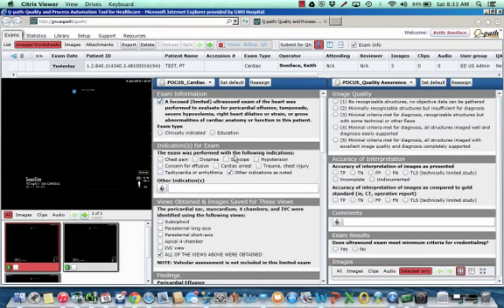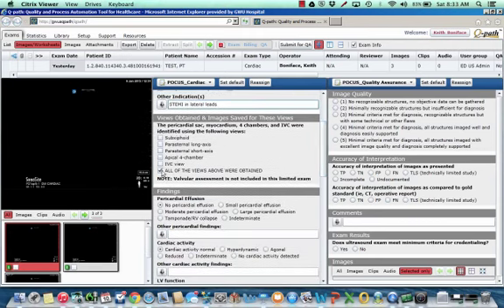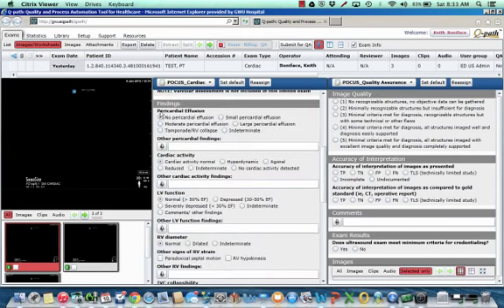Okay. After that, indication for the scan. I'm going to sound like the radiologists here. The more information we get on Monday morning, the better it is. So if you can say this person had ST elevations in lateral leads, that way we know to look at the lateral wall on the echo. This automatically defaults when you click the default tab here to all of the above. Then just click your way through.